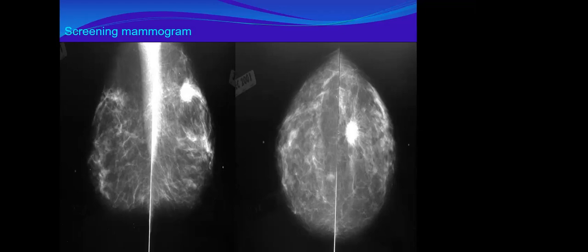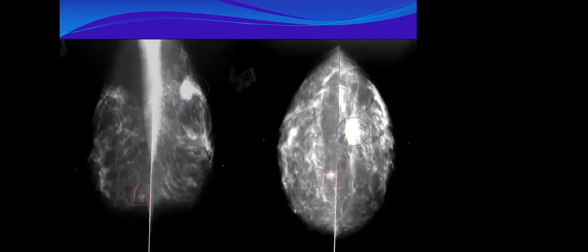We said if you have seen a lesion, go from the nipple. If you draw the line like this, you need to go at the same line. Take the same line from here, in the lower part. Yes, posteriorly. So it's an area of focal asymmetry. Yes, so this is focal asymmetry.